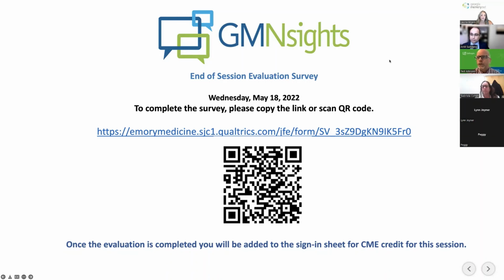And Dr. Hales wrote earlier, although rare, this also highlights the importance of always making sure to review all the sequences when evaluating patients: FLAIR, T1, GRE, susceptibility for blood, diffusion, et cetera. Sometimes we see incidental strokes as well when ordering MRIs for dementia evaluation. Thanks for that comment. Yes, and so I left out diffusion from the standard dementia protocol. That was the one I left out. So looking for incidental strokes.